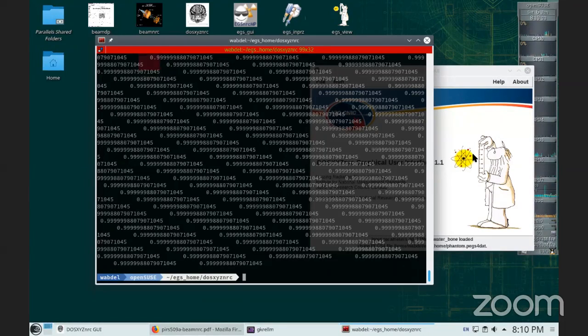You need a monster machine, and if you can have 2 or 3 machines, the more the better. Suppose in a plan you have 2 or 3 beams. MMCTP will submit one beam on the first machine, the second beam on the second machine, the third on the third one, and do the parallel processing so that you get the results as soon as possible.